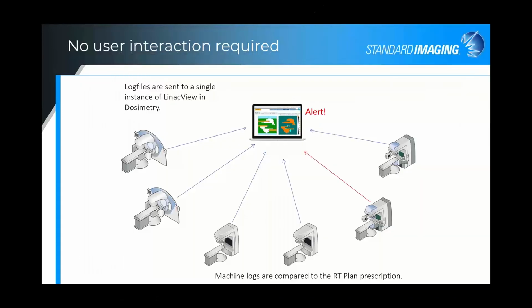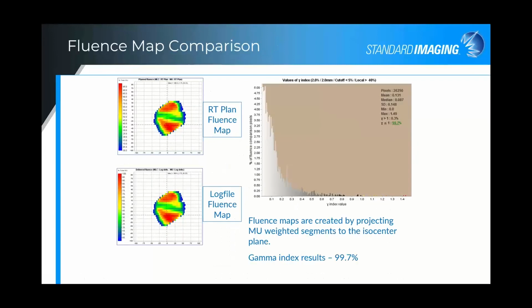So with that, I'll continue on a bit through the slides just to keep things moving. I showed you the basic dashboard, which would be open in the treatment room or dosimetry. And now I'm going to transition into some sample fluence comparisons. Should you want to review even your passing plans, you can go into the software or look at PDF reports. If you select to have those automatically sent even for passing, that's probably too much email, so you would probably not want to do that.